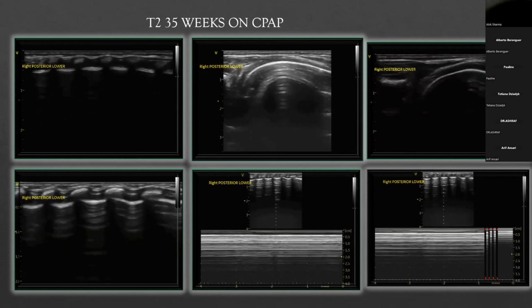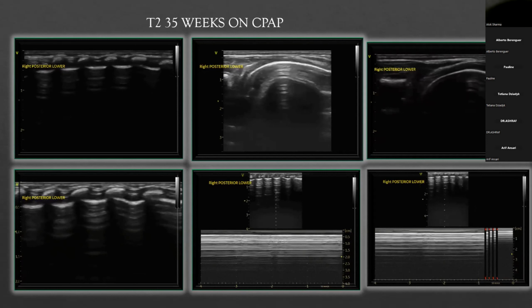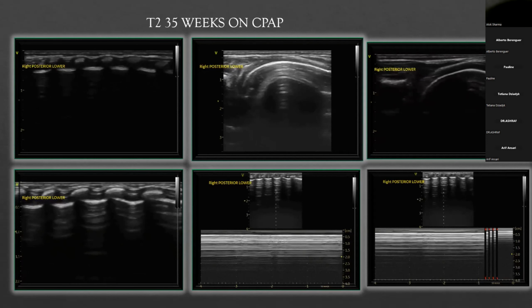But if you have a large pneumothorax and air in a supine position accumulates anteriorly, eventually you will lose sliding in the whole of the lung anteriorly, and you would be tracing the size of the pneumothorax in such situations by moving towards the anterior to mid to posterior axillary line. What I'd say is that once you start losing sliding in the posterior axillary line, that's quite a large pneumothorax. Okay. Thank you.